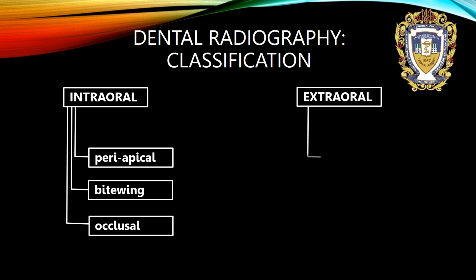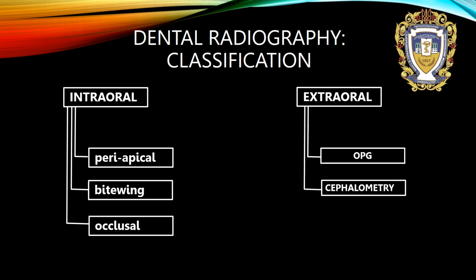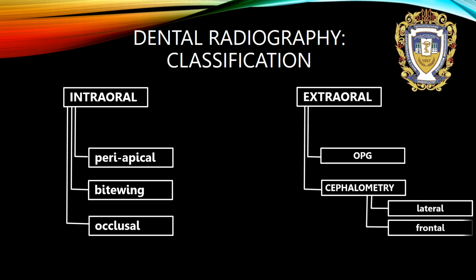Extraoral X-rays are divided into panoramic X-ray, or orthopantomography, cephalometry, where cephalometric X-rays are divided into lateral and frontal, and sialography.